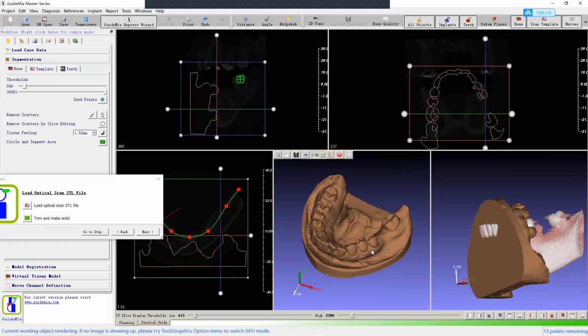Right now, if we look at the data set, they are not in the same location. So we need to put them in the same location, align them, in other words, so we have a complete anatomy. So the reason I'm talking about this is here.